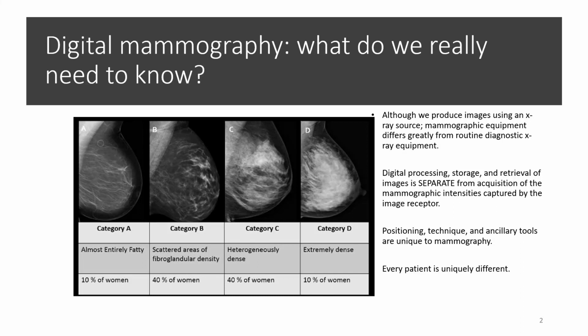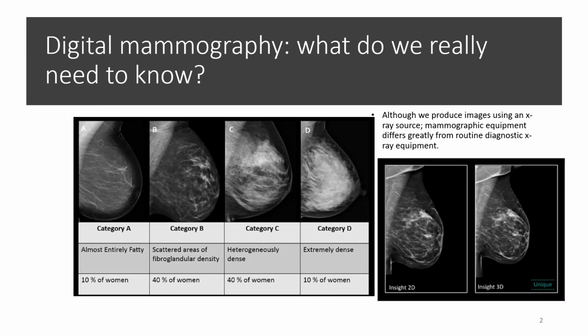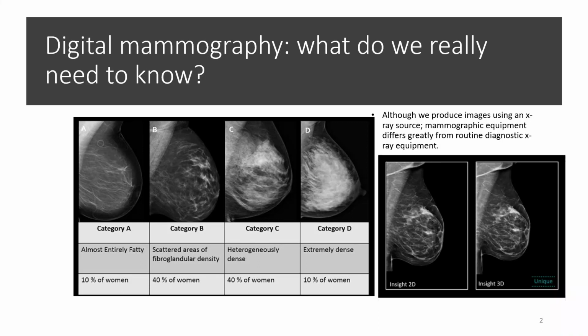Digital mammography. What do we really need to know? Although we produce images using an X-ray source, mammographic equipment differs greatly from the routine diagnostic equipment. We also know breasts are like snowflakes. No two are alike. Each patient is unique and different.